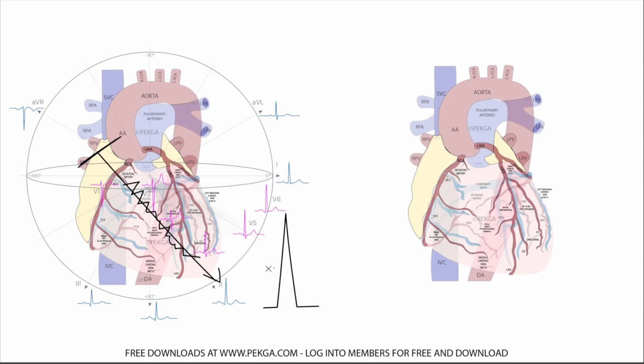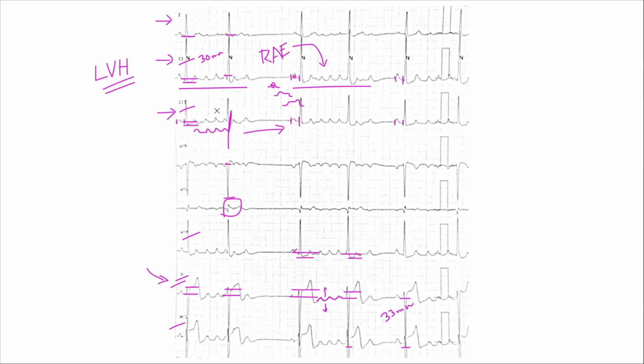Okay. While, for example, if you take a look at lead 3, right, it's going to be covering much less of the heart. So you would expect to see a smaller QRS signature. Now, if we go back to the ECG, what do we see? Lead 2, the signal is humongous. Lead 3, significantly smaller. So yes, indeed, I would say that this person does have some sort of hypertrophy, and they would benefit from an echo.